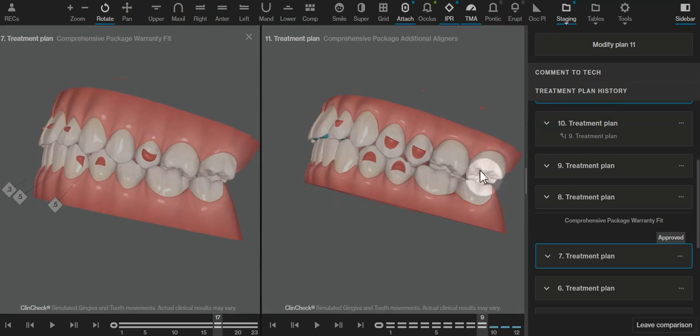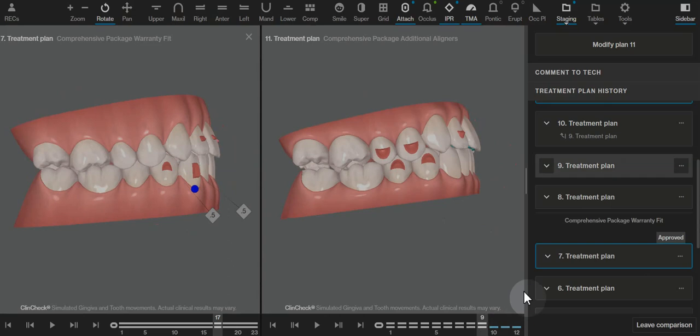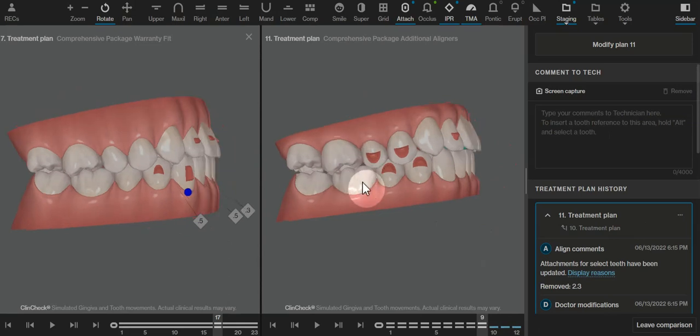If part of the molar posterior open bite is from molar intrusion, the solution would be to cut the molars off of the trays, so you can keep these attachments all on and then cut those molars off after aligner 9. It's nice to have passive aligners built into the case, so that's one thing you can request. You can say, please add 3 upper passive aligners, so that you can give the patient 3 different aligners to allow those to try to settle.